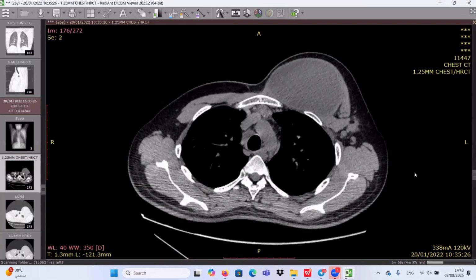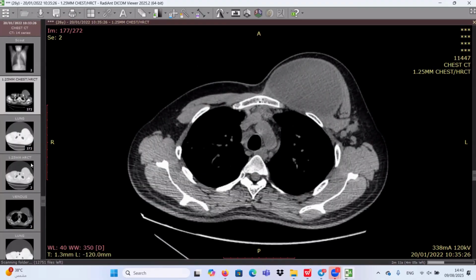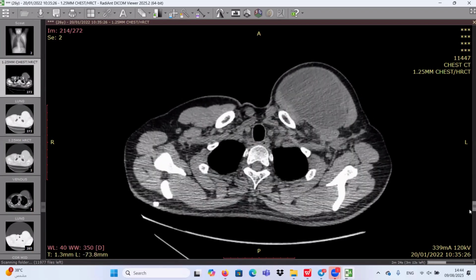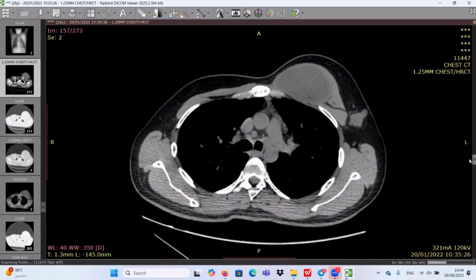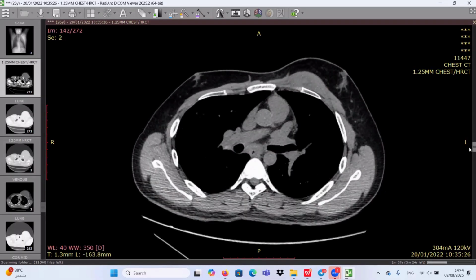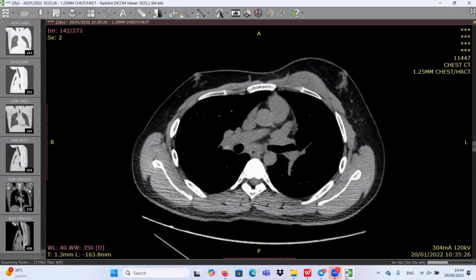I would like to look at the lung window because I spotted a left lower lobe nodular lesion. I will show you what your possibilities are here in this mass. Before going to the lung window, do you have any differential diagnosis? I'm thinking along the lines of a neoplastic etiology, given the multiple enlarged lymph nodes and the left chest wall tumor. Okay, let's see.